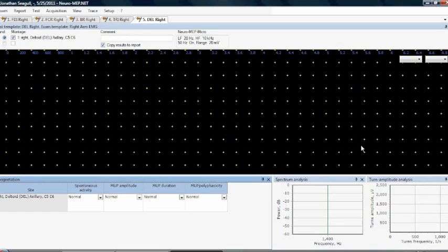Once you're done with that, you can go to the report, or you can finish the exam and take it up some other time, continue it. So basically, that's the needle exam in the upper extremity. Lower extremity essentially follows the same principle. Let's go over the screen.